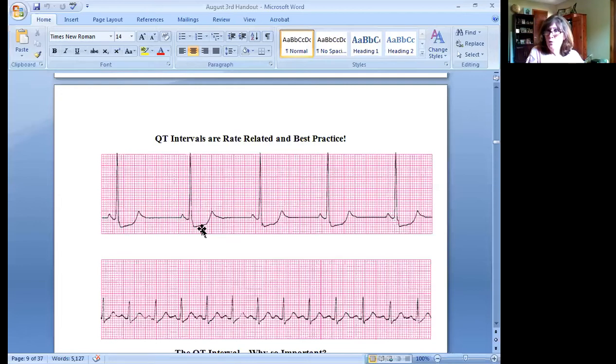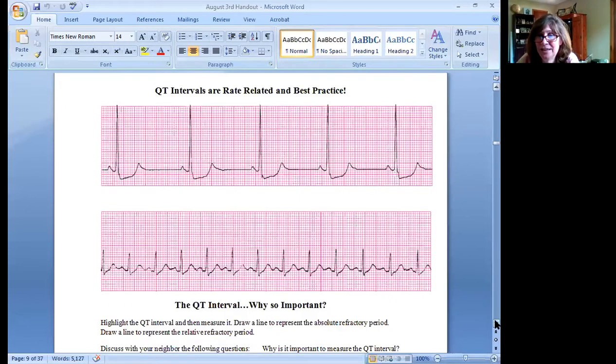If it was only 0.48 at noon and now it's 4 o'clock and it's 0.56, I'm calling Bourgeois. I'm calling him. First, I'm going to go check my patient who's probably fine. I'm going to have my medication administration record, my MAR, my labs all front and visible so I can start answering those questions. And I bet you Dr. Bourgeois is going to make some sort of a change. That is some ST depression. We'll talk about that more in perfusion too. It indicates cardiac ischemia. Might need a little nitro.